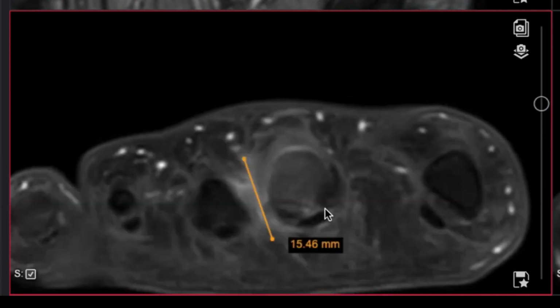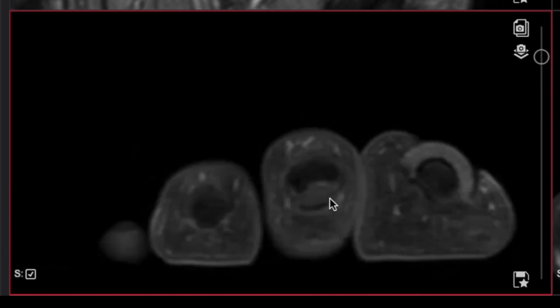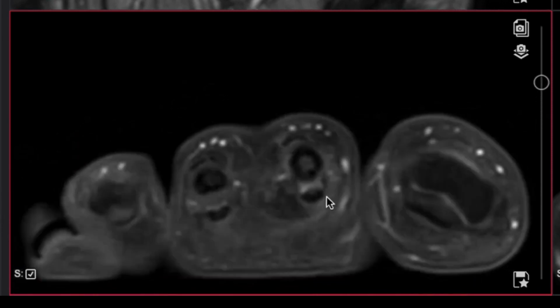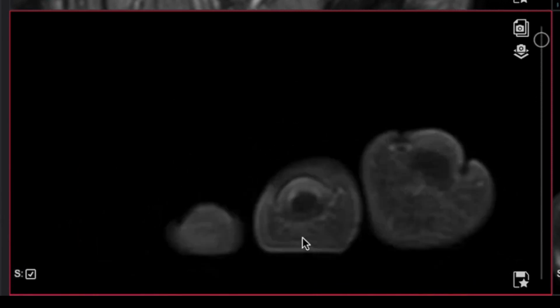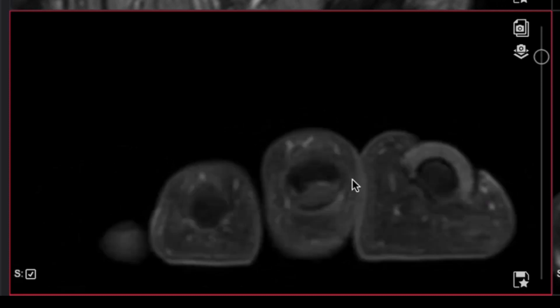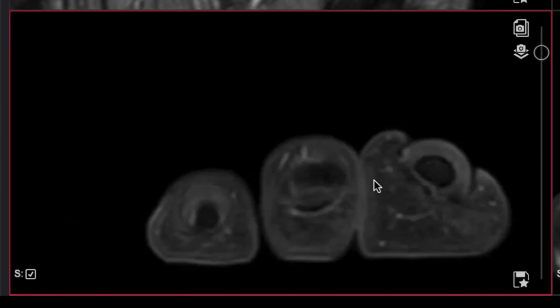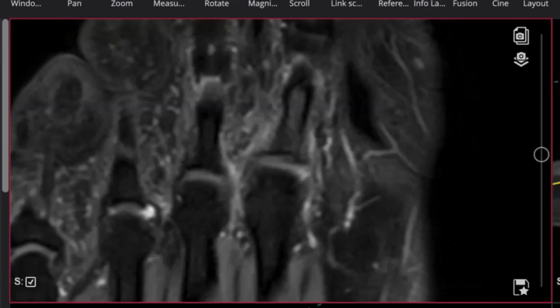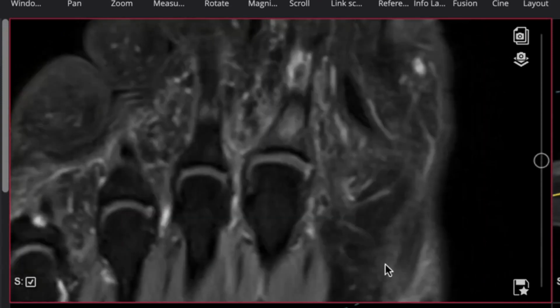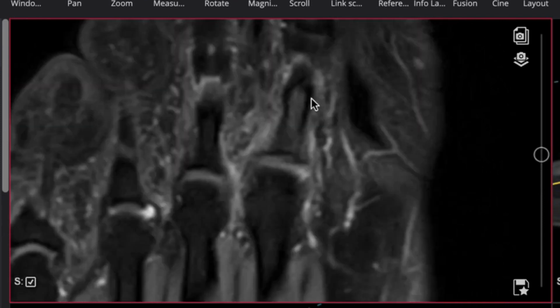And I try to understand whether or not there's a medial crossover occurring. That would be more likely for me to understand or predict whether or not there would be a plantar plate tear. And in this case, we can see that the distal phalanx turns medially, and we have this mild medial crossover where the skin between the first and second are compressed. And we get a sense here of this phenomenon where the rotation of the hallux and the second metatarsal is putting it in closer proximity.